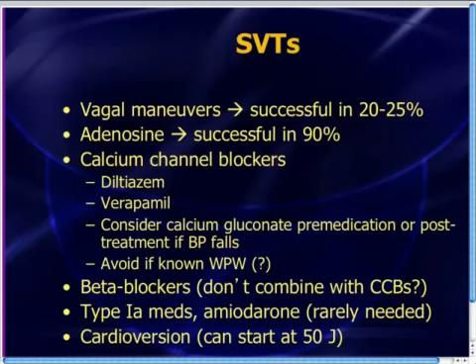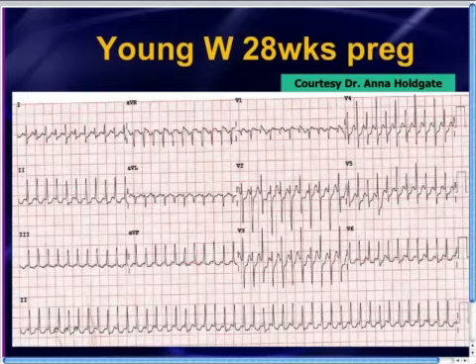Okay, actually, you know what? Let's go back to the original EKG just to make sure that everyone's on board with our diagnosis. We got 3 possibilities: sinus tach, SVT, and flutter. So, is this possibly sinus tachycardia? Well, with the rate of 270, you automatically know it can't be sinus tach because nobody runs their sinus rate that fast. But looking carefully for the atrial activity, there's no PQRS, PQRS, PQRS.